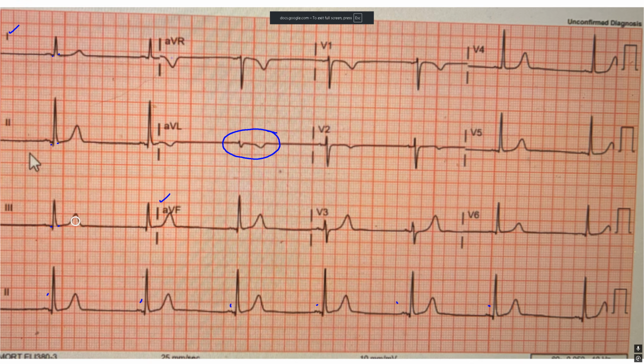Not much J-point deviation, but I don't like this morphology right here. That morphology wasn't like that before. Same thing here. We got these sus T waves and this change in morphology, again, which is not specific. Again, looks good up here in AVR, check. V1 looks good, check. V2, no J-point deviation, but I've noticed it's gone from flat to inverted. No J-point deviation, again, definitely hyperacute T wave. Same thing here. We got these sus T waves in laterals, but no real J-point deviation.